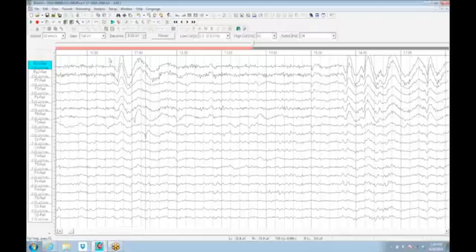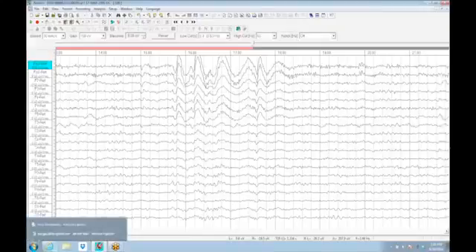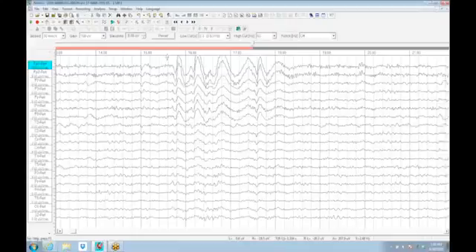The EEG you can set up to mark all of these and remove them, or you can alternatively extract the eye movements, leaving the rest of the EEG basically intact. And to do that, you can mark these in the older way of removing artifacts and clipping them out one at a time, going through.